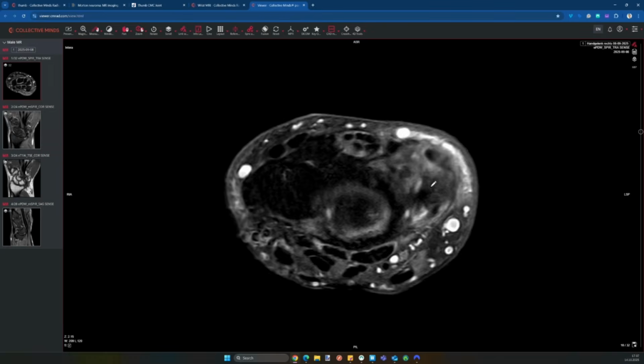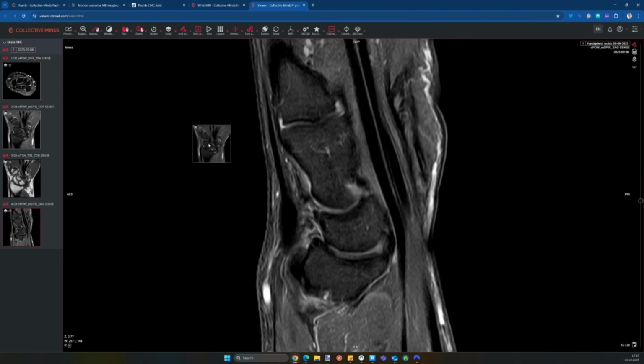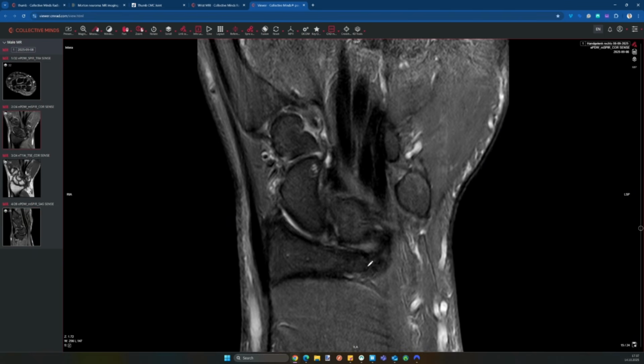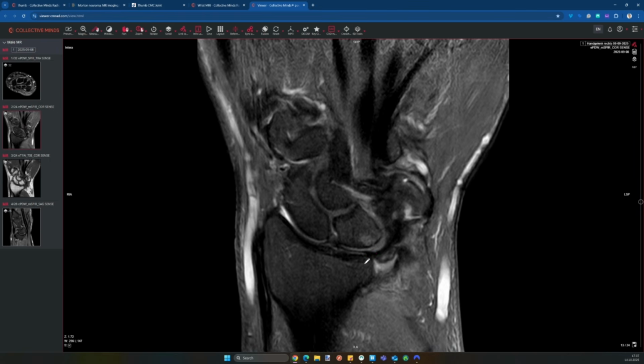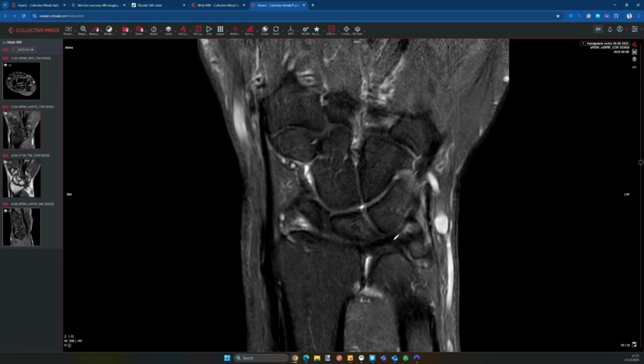And I think the reason for this is mostly injury to the dorsal one, the dorsal radioulnar ligament. It's not really the volar one. When we go to the volar one, we can see the volar ulno-lunate ligament here very nicely, black. We go here, we see part of the ulno-triquetral ligament, also quite okayish. The disc itself then here is also not perforated or anything like that.